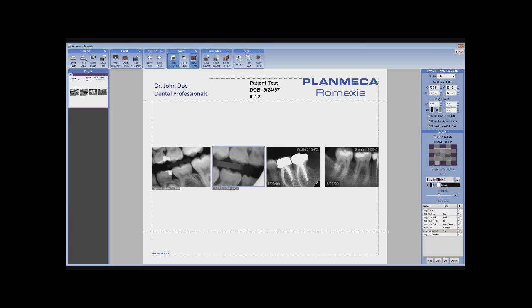Okay, so we also want to remove this scale percentage by deleting this scale free text. You could leave in the image comment if you want. Probably want to identify the same as before for the image date, which I've identified as exposure date with a label. Okay, press Enter when you're done typing, and then use the up to position it before the image date field.